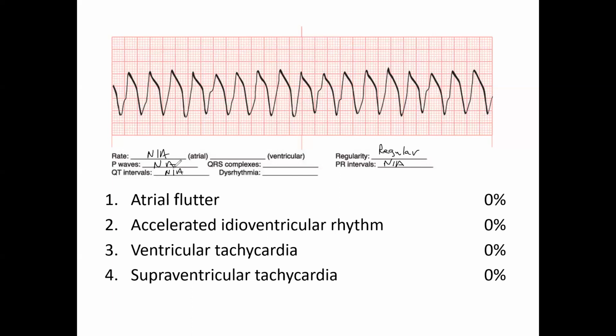If we look at the ventricular rate, look at your R waves. And remember, this one gets cut off, so with a 6-second method I can't utilize that one. So if I go up here and I count them, 1, 2, 3, 4, 5, 6, 7, 8, 9, 10, 11, 12, 13, 14, 15, 16, 17, times 10. So that gives me a ventricular rate of about 170.